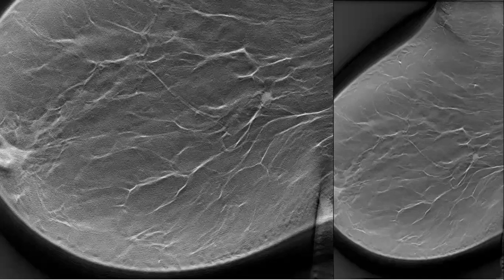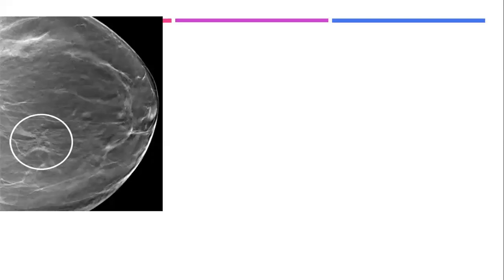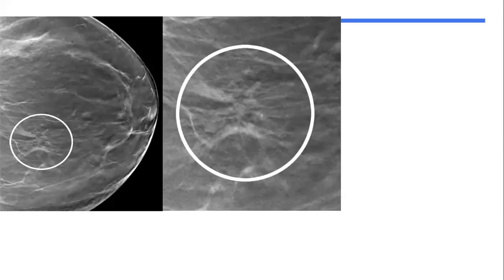We have to be sure that they are intramammary lymph nodes before calling them that, and now with the use of tomosynthesis, the borders and the fatty hilum of this intramammary lymph node can be seen. What about this? This is an example you can see.